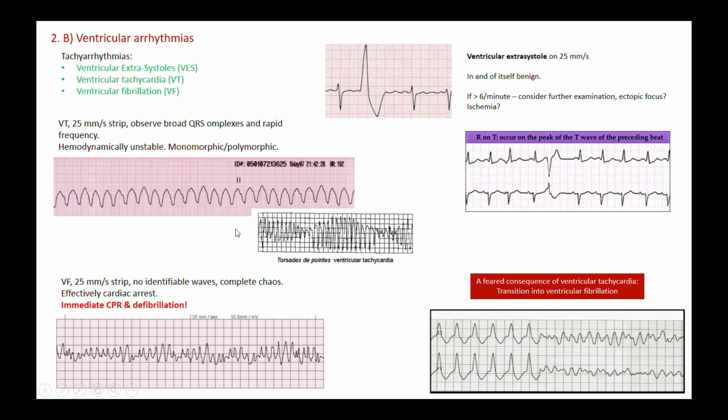Now, you can describe ventricular tachycardias as either monomorphic, meaning that they have a more stable shape like here, or polymorphic, which is the famously named torsade de pointes, a ventricular tachycardia where you see it kind of snakes around the isoelectric baseline. It kind of twists around it. And they are usually associated with a worse hemodynamic condition than a monomorphic ventricular tachycardia.